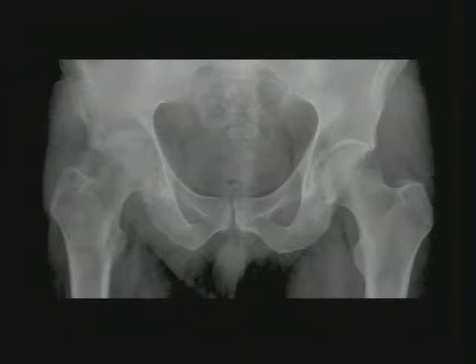We want to look at the fat planes if all we have is a radiograph, and there are 3 around the hip. You have your gluteus medius fat plane laterally, iliopsoas medially, goes down to the lesser trochanter, and in the middle, medial to the acetabulum, the obturator internus fat pad, which is the most sensitive when you have a big effusion.